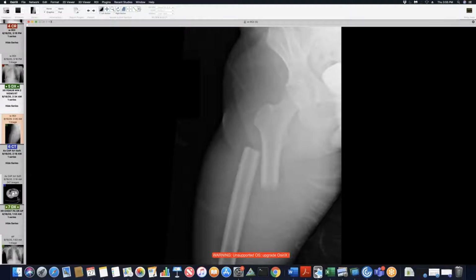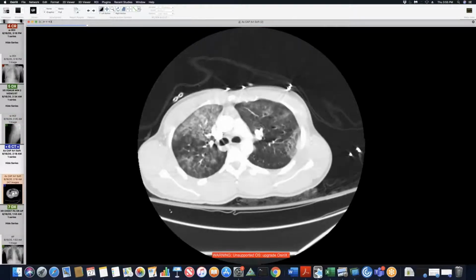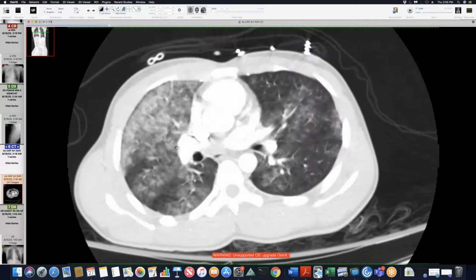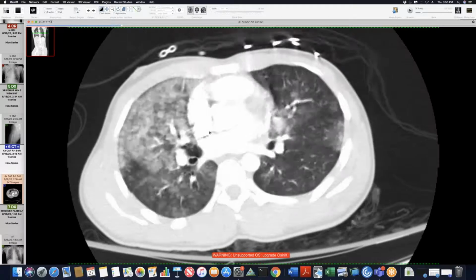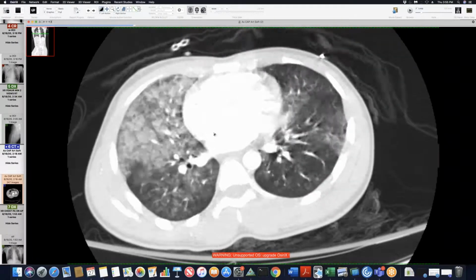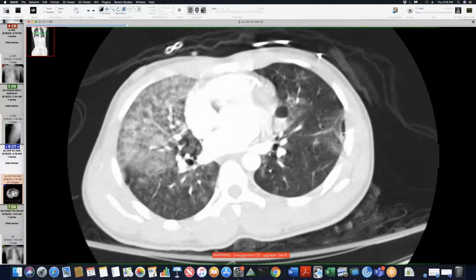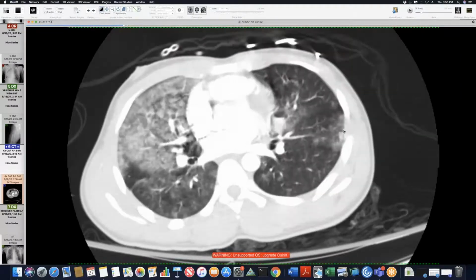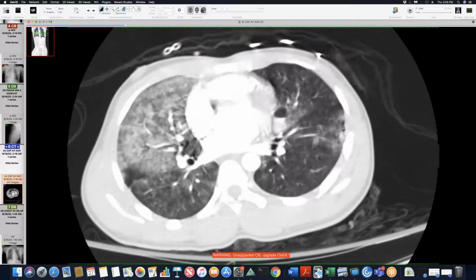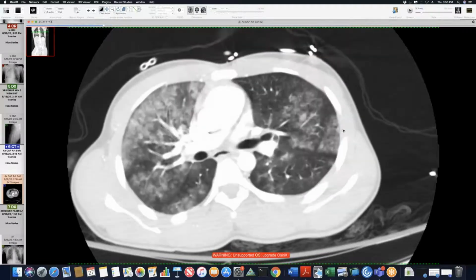I think this was dictated as pulmonary contusions, just ground glass, concerning for pulmonary contusions. But, oh, he's got more than one. Traumatic lung cysts on the other side. Yeah, so there is a traumatic abnormality, like a little laceration probably here, but there's no rib fractures anywhere.